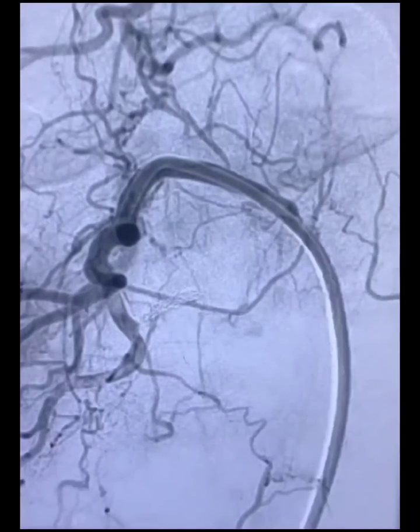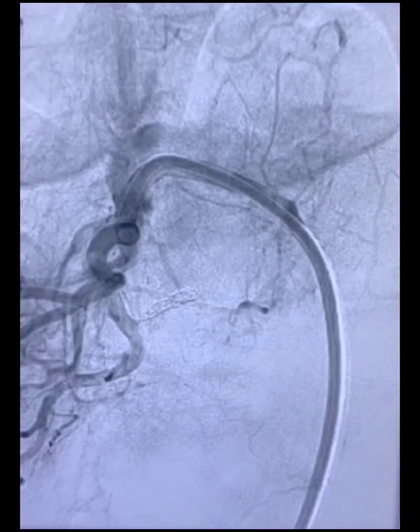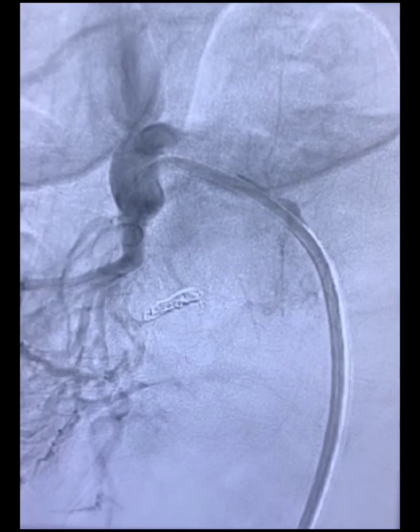A thin slice MRI is key to identifying dural arteriovenous fistula in LETM. Arresting competing flow can be the key to complete occlusion of fistula.